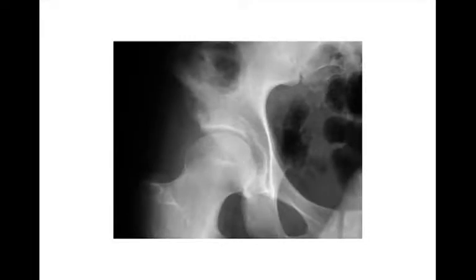All right, frontal radiograph. This is not very easy to see, but just to show you there was a lytic lesion here. This was actually real. It wasn't overlying bowel gas or whatever. And this was a patient with EG or Langerhans cell histiocytosis. Nothing shouts, hey, this is typical EG about this case. This could be all kinds of other things, and if you're stumbling across this case for the first time, you're going to end up giving a wider differential diagnosis because there's nothing pathognomonic here. This one just happened to be EG in this case.